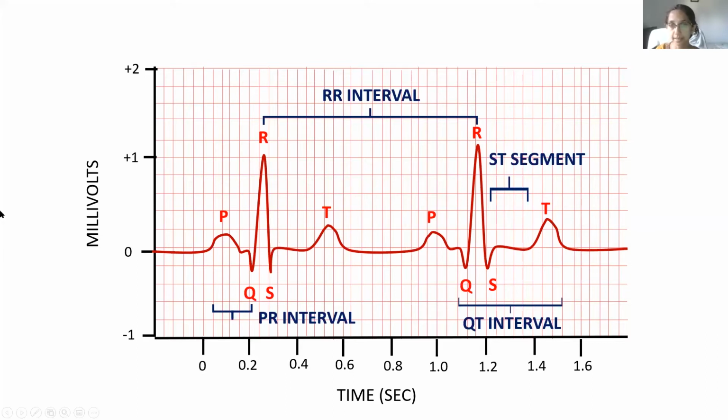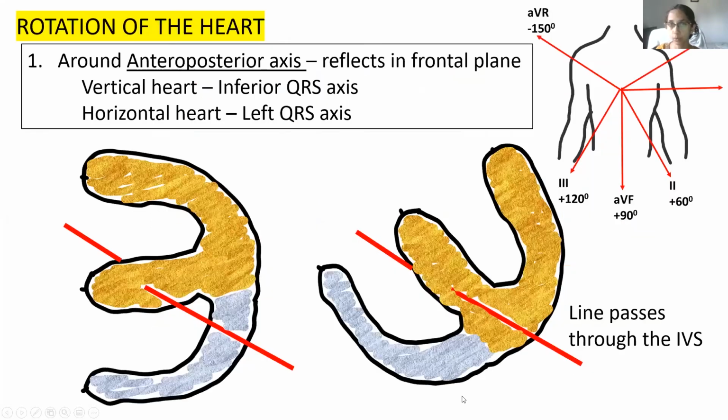The ST segment is end of S and beginning of T. And T wave is beginning of T to end of T, which is ventricular repolarization. The QT interval, beginning of Q to end of T. And in case, U wave after the T wave, which is in the same direction of T wave. Now with this understanding, we will move on to the electrical axis in detail.